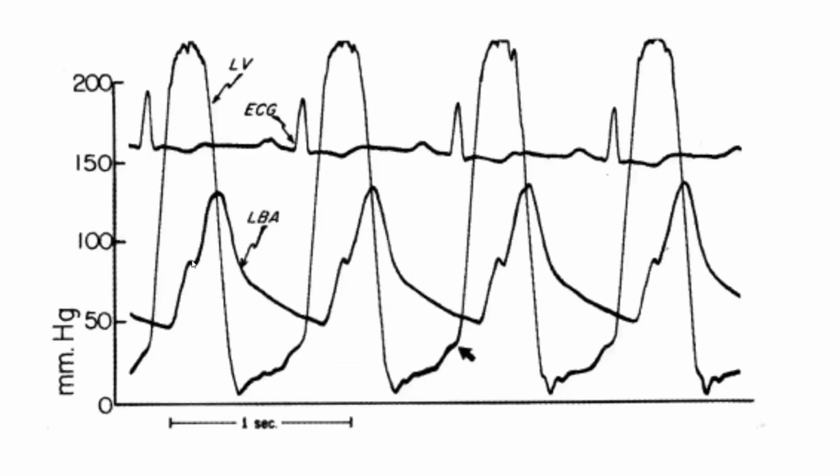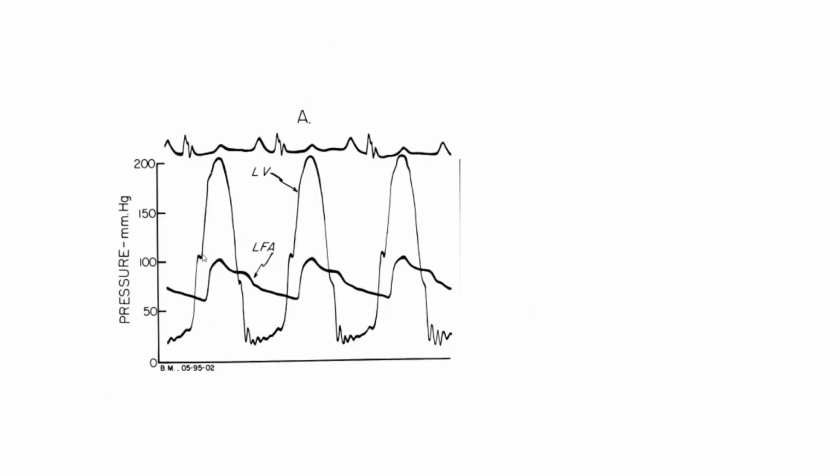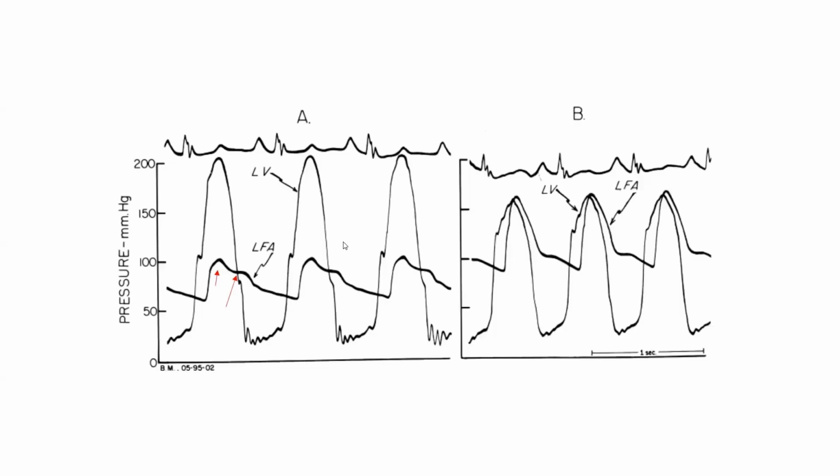You get it on the aorta in AS. You get that bend on the LV in dynamic LVOT obstruction, beyond which the LV gets late peaking while the aorta drops in a spike and dome fashion. How do you further prove HOCM? You can do pullback and you can do dynamic maneuvers.